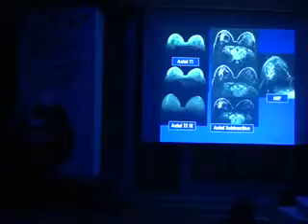So in the MRI, like my colleagues just explained yesterday and today, about the technique, about the findings in benign and malignant lesions and so on. You have here a set of images, axial T1, axial T2 and inversion recovery, the subtracted images and the MIP of the same case. Remember, on the mammogram we just had asymmetry in the upper outer quadrant and prominent ducts by ultrasound, as well as a subtle heterogeneous hypoechoic area.